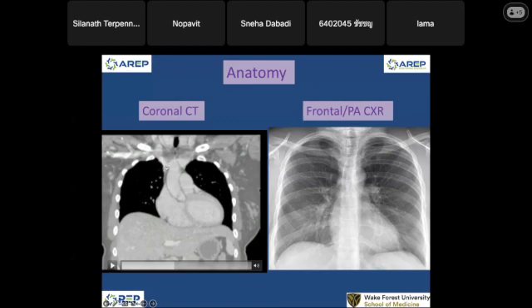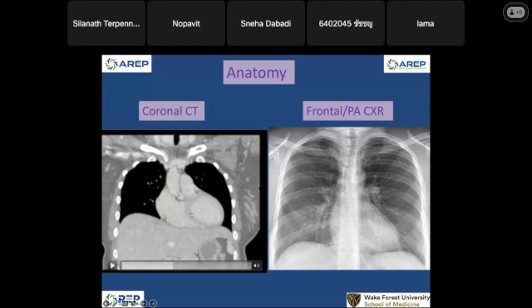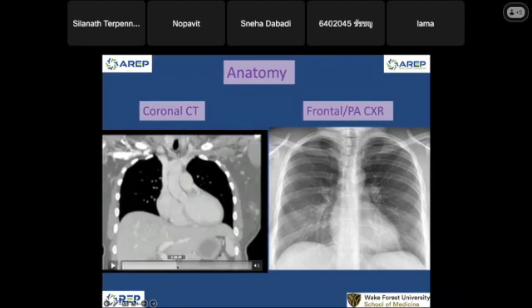Pretty short. Okay, and then if you go a little bit further, so this is the brachiocephalic vein on the left. This brachiocephalic vein is coming from the left internal jugular and left subclavian. Now the left and right brachiocephalic veins join and become the superior vena cava. This is the superior vena cava, and it is entering the right atrium.